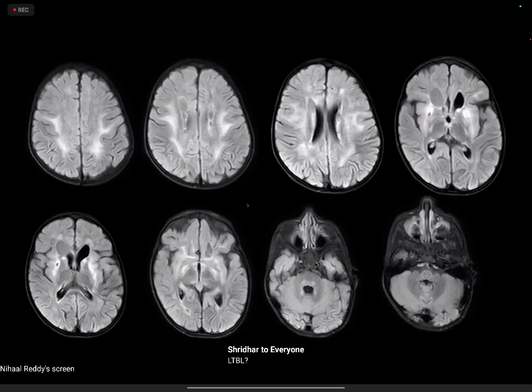Yeah. And the basal ganglia affection, what exactly is it, and is it pointing to any particular disorder? In the basal ganglia, at the moment you are picking up mature scarring, and I think the central tegmental tracts were also involved. So I wouldn't take mitochondrial away from this, Neha, if that is the crux of the question.